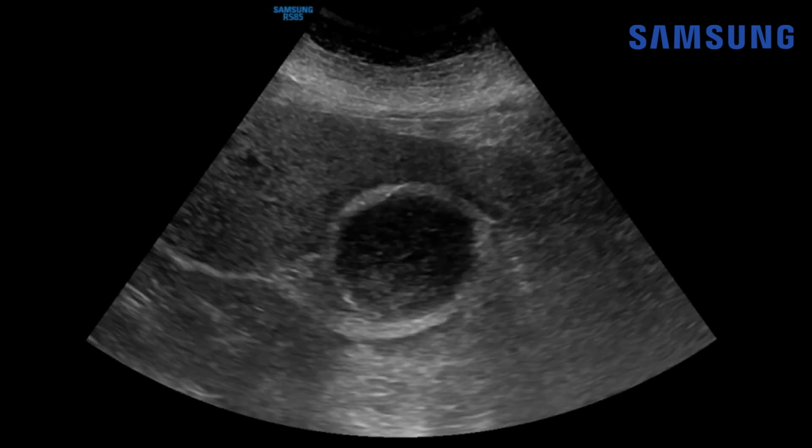As far as the definition of gallbladder wall thickening, if it measures more than 3 millimeters, that's typically considered abnormally thickened. And for the diameter of the gallbladder, the transverse diameter is a more specific measurement for true gallbladder distention, and if that exceeds 4 centimeters, that's typically abnormal. In this case, it was 5.4 centimeters.